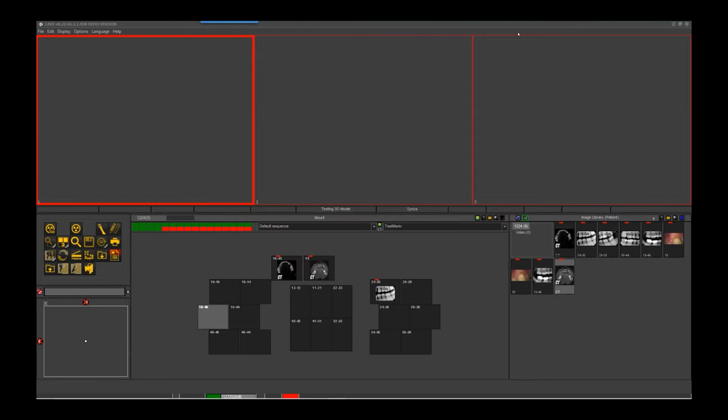But the 3D imaging is a huge part of it, and those are whole separate files on a different computer, and we can't get them in front of the patient because they're on that server, and only on the doctor's computer. I think we only have like 2 computers that we can actually see those on. So this does allow us to get it in, and if we could just copy it into the patient's chart, like you said, with the little thumbnails, that would be amazing.